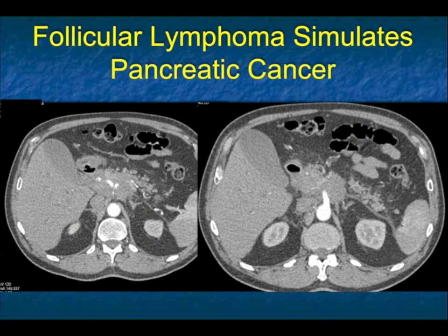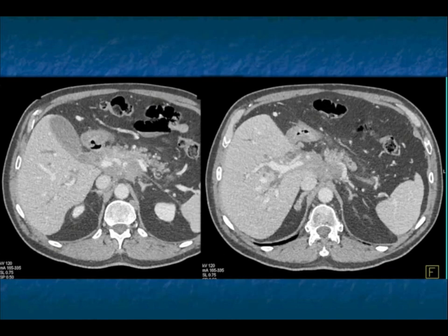This was a bit trickier. It was localized into the peripancreatic region, going up into the hilum. Cholangio you could think of, but it's too bulky. Adenocarcinoma of the pancreas is probably my best choice, but this ended up being lymphoma.